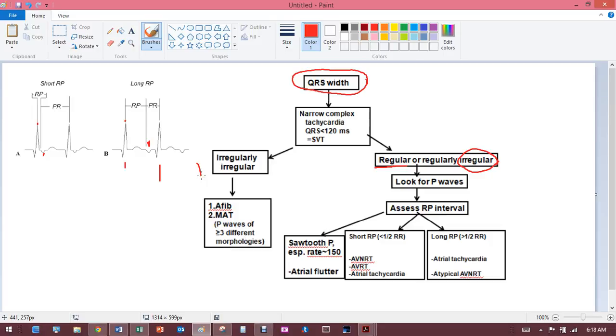So if that's what's happening, then you need to look at the P waves. Remember, the little P wave should be the little bump prior to this. In this case, the P wave here is before the QRS complex. The P wave fires, and that's the atria going off, and then the QRS complex goes off over here, and that's the ventricles going off. And that usually happens, first the atria, then the ventricles, and that's good.